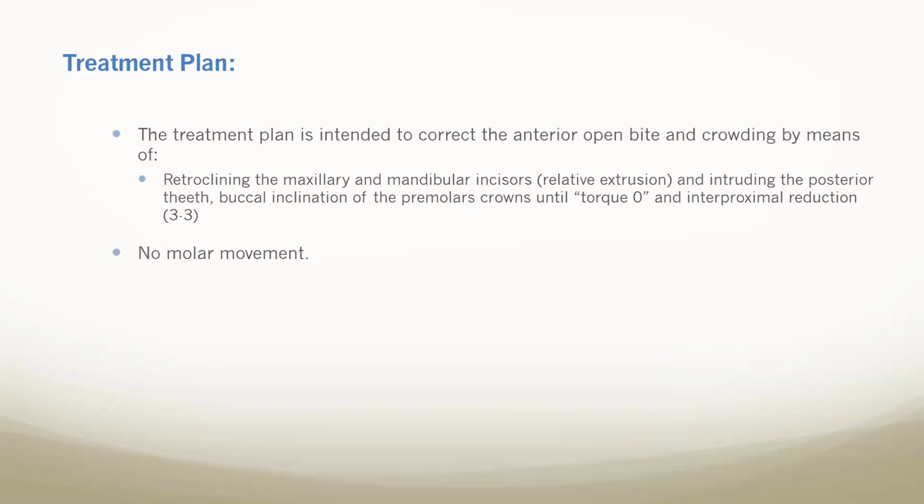So the doctor's treatment plan is intended to correct the anterior open bite and crowding by means of retroclining the maxillary and mandibular incisors, relative extrusion.